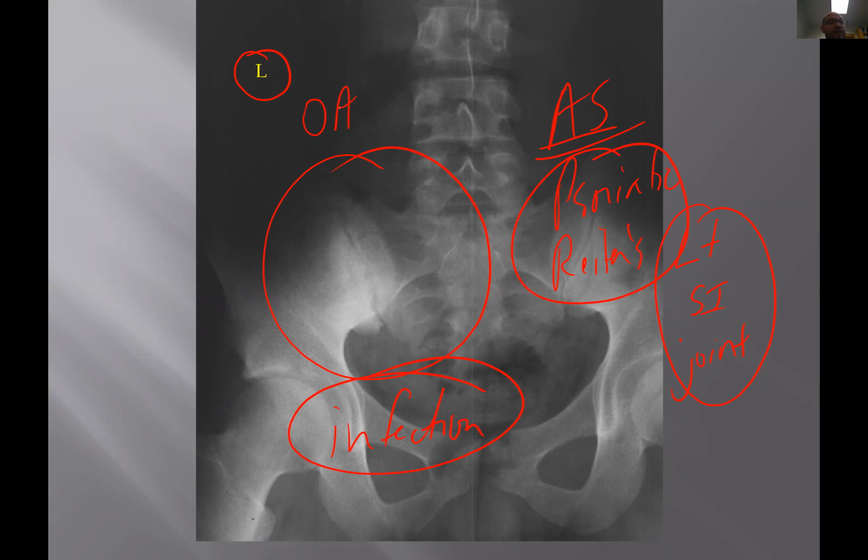I admit it might be sclerotic with OA from old trauma, but here's how you tell the difference: the joint will be narrower with OA. And you will almost always have inferior osteophytes at the joint. Inferior osteophytes at the joint. That is how you tell the difference.